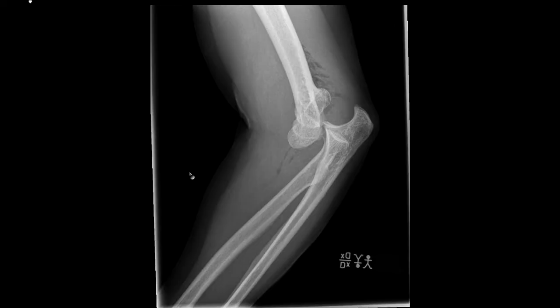Alright, so here we have an elbow luxation, and if you remember how I showed you the normal anatomy, this is not the normal anatomy. This is how it looks bad, alright? So I guess it's amazingly painful because the humerus is completely out of the socket. When I see this kind of stuff, I just feel bad for the patient.